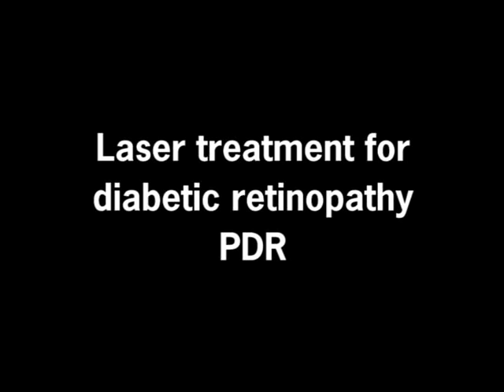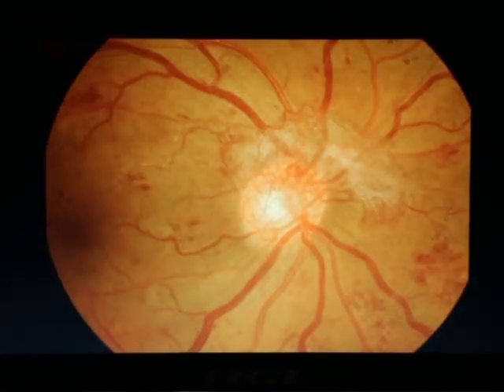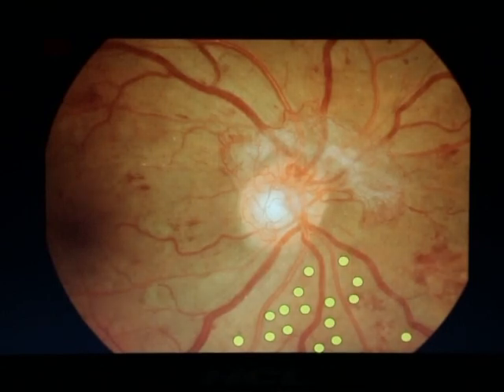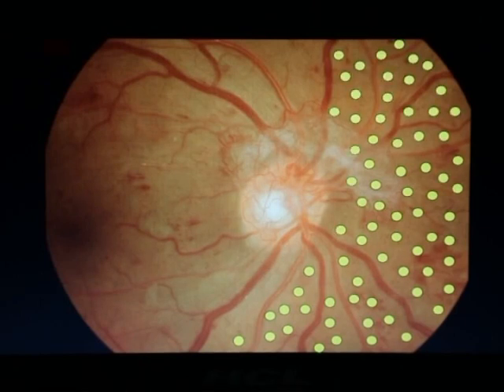Diabetic retinopathy is the commonest disease that warrants laser treatment. The proliferative form is treated with a pan-retinal laser photocoagulation protocol. Laser burns of 400 to 500 micron width are applied with a spacing of 1 burn width and continued over the whole extent of the retina, taking care to avoid major retinal vessels and areas of large superficial hemorrhage. An area of 500 microns around the nasal disc margin is also avoided to minimize thermal papillitis.